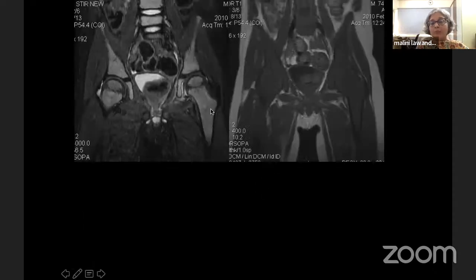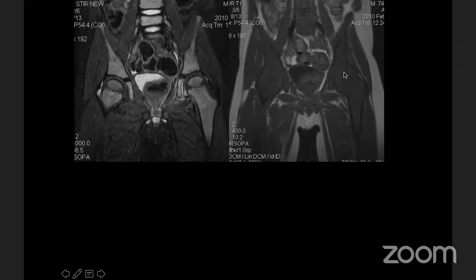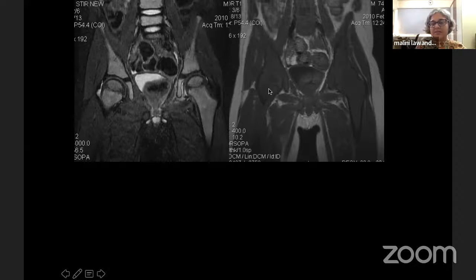And then one more, which I think is very important, which can be missed if one is not careful. When I look at this MR, all the bone looks very hypointense. Remember, as soon as the ossification center is formed, it is fatty and it remains fatty throughout. Here, the epiphysis also, in this child who just came with some minor trauma, fell off a swing in the school, has diffuse dark T1 weighted hypointense signal, which is bright on STIR.